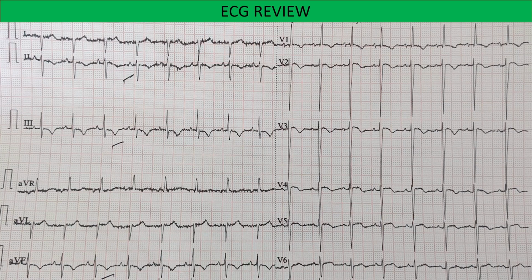Today we have an interesting case of a 30-year-old male with right ventricular hypertrophy. Let's examine this ECG using a systematic approach including rate, rhythm, axis, hypertrophy and infarction.